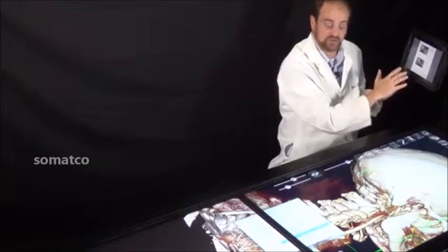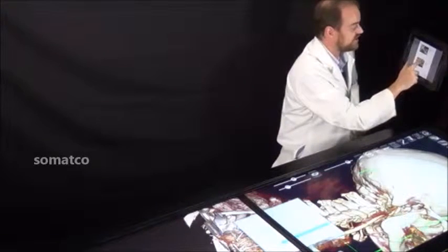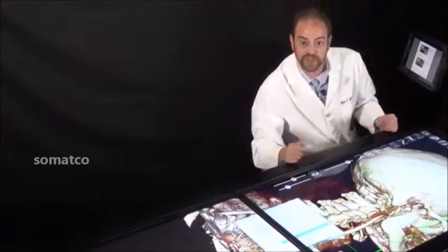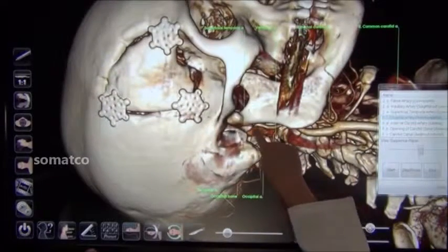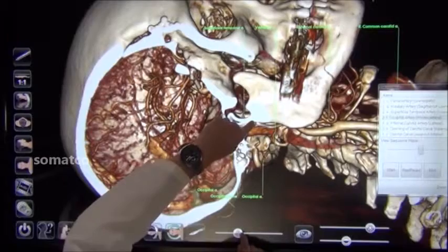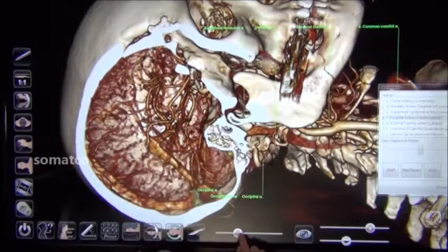As we turn back to the curriculum guide, we can note 2 bullet points highlighting specific anatomy that could be mentioned in this demonstration. For example, we have now identified the external carotid artery with its branches to the face and neck. Additionally, we can highlight the 2 terminal branches from the external carotid artery. The terminal branches would be the superficial temporal and the maxillary. Thus, as we change the cutting plane, we can see the superficial temporal as well as the maxillary artery, and can define this point as the approximate termination of the external carotid artery.